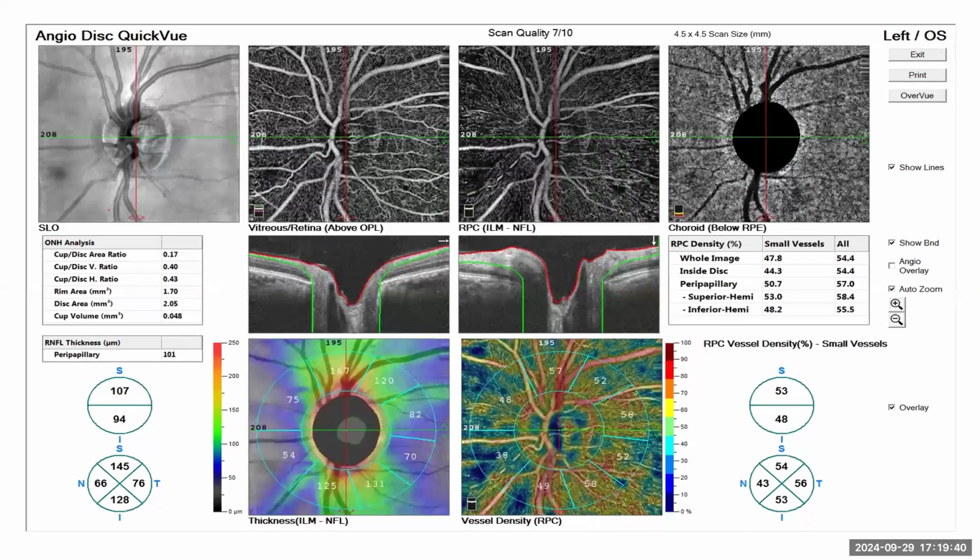So somebody said he noticed that the inferior quadrant, or she noticed that the inferior quadrant is always lower. It's not always the same, but I've selected some ones that have some specific things for discussion. It's not always lower. In some persons, it's actually higher. Although the superior quadrant gets to have more supply comparatively, more fiber thickness. But when you start analyzing it lower down, you'd see that the temporal has more supply.